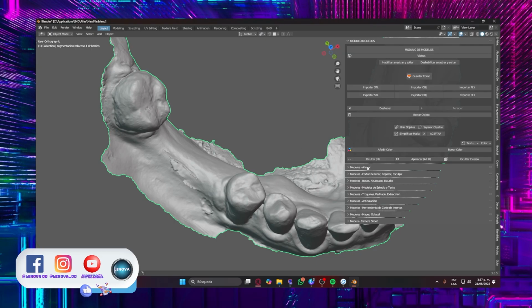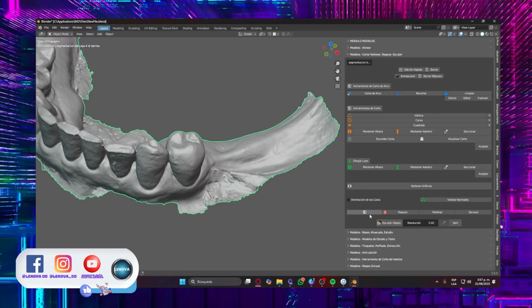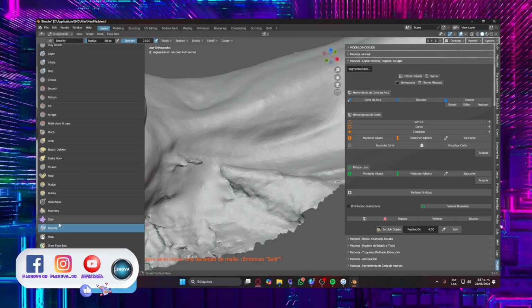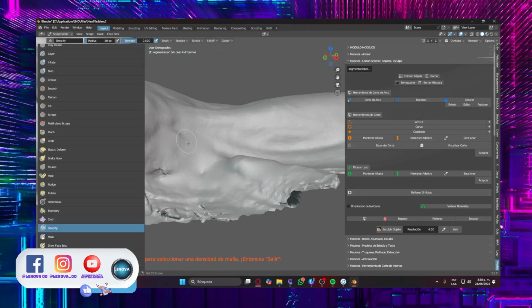I go to the third tab, Model Cloud, and select Scope. By selecting it, I start to smooth. I want you to see this. This smoothing I'm using is called simplified smoothing. What does it mean? That smoothing with the smooth I have up here, if I use smooth, I deform the surface. Simplified smoothing reduces its distortion margin, maintains the surface, and smooths that surface without distorting it. So that's what I need to use because the software has it for that type of problem.